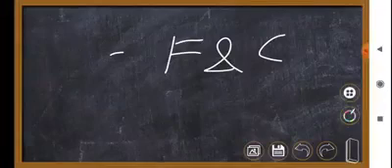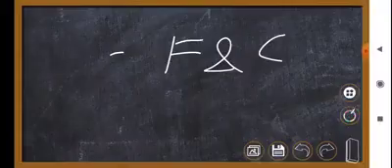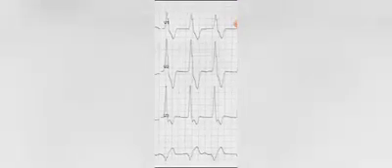Now we will be discussing the ECGs with examples. So here is the first ECG demonstrating accelerated idioventricular rhythm, and here the heart rate is almost 80 beats per minute, and we can clearly see, just look at V1, V2, V3 in this ECG, and note the wide QRS complex, and also note the left rabbit ear of the QRS complex, especially in lead V1 and V2.